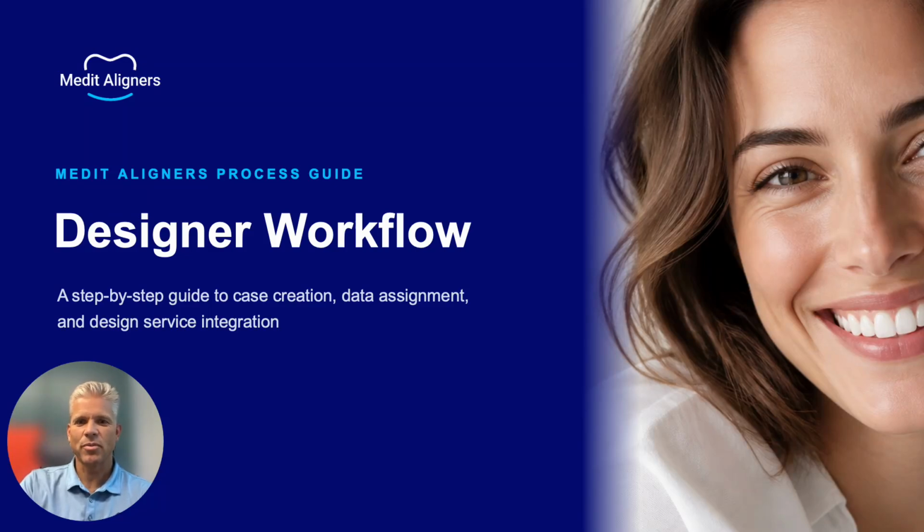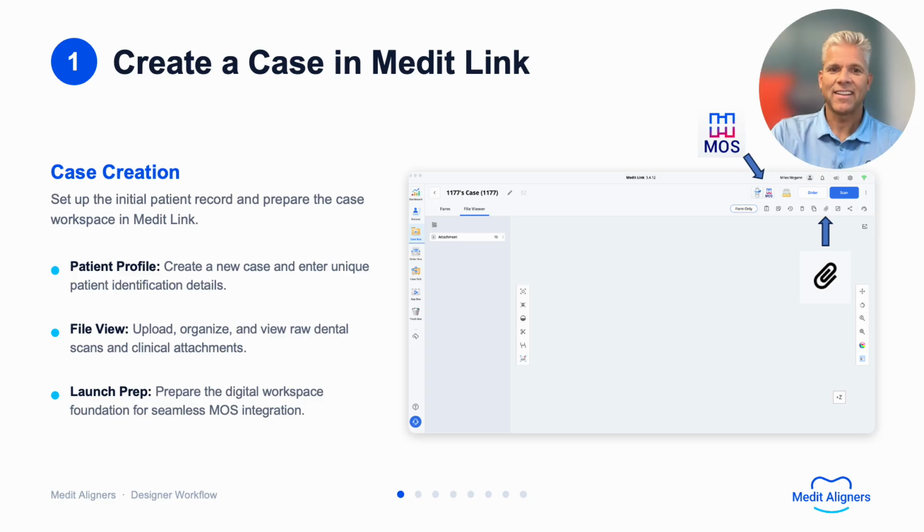I'm going to show you the simple steps for using the new design service when ordering Medit aligners. First, we need to create the patient in MeditLink. If you used a Medit scanner, you will have already created the patient and entered patient details in MeditLink.